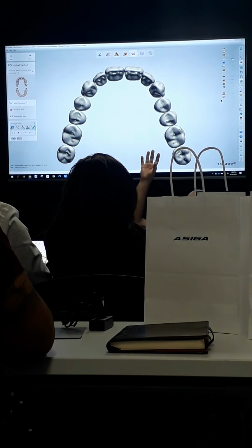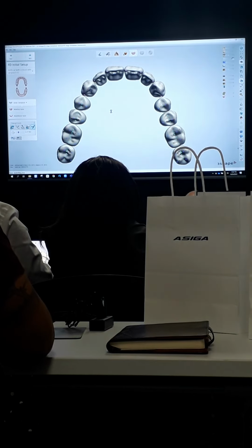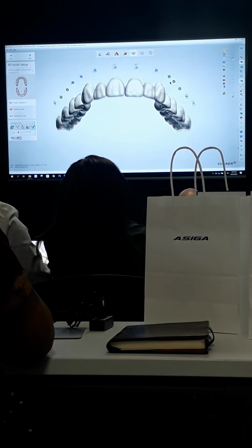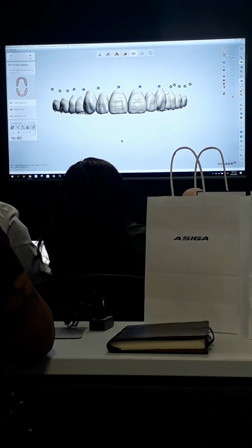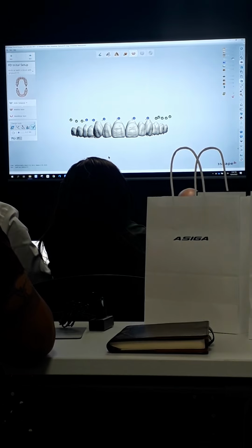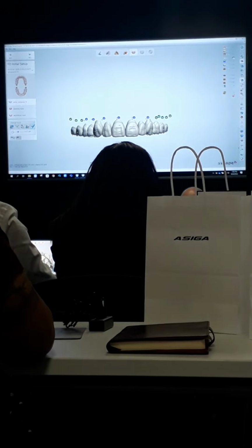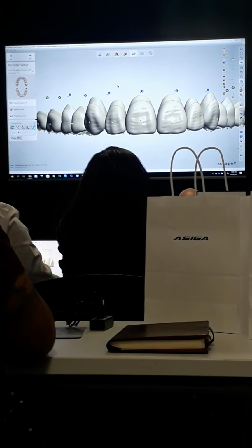No one? Okay. So when you do this with stock denture teeth, you can use this bullseye slider here at the very bottom right, and this will show you where you have overlaps. The reason this is important with carded teeth is because if you have an overlap between two teeth, when you go to drop the teeth into the pockets, they won't go in the same way that they were designed. You'll have to adjust contacts in between. So this is a good way where you can see.